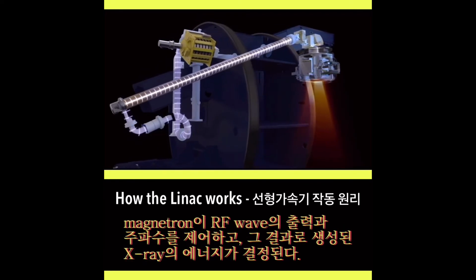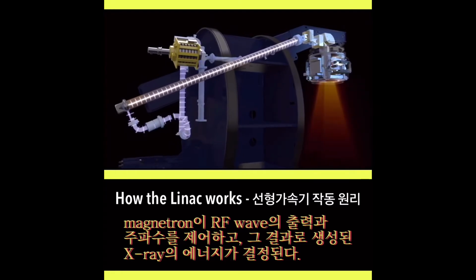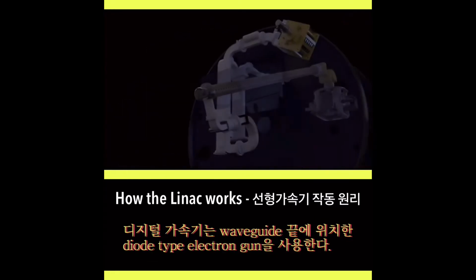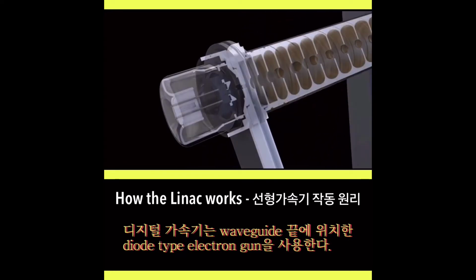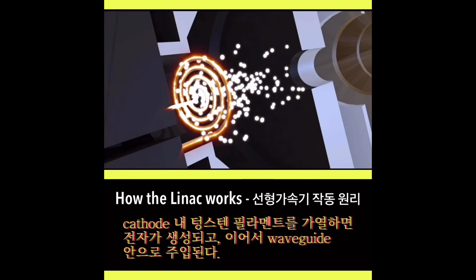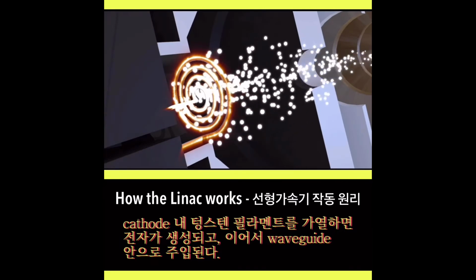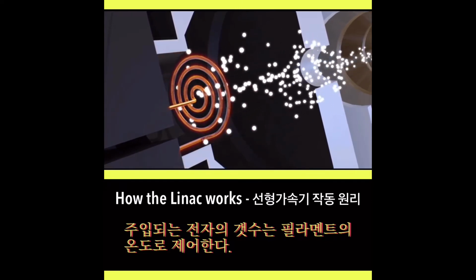The magnetron controls the power and frequency of the radio frequency waves, which determine the energy of the X-rays produced. The digital accelerator uses a diode-type electron gun situated at the end of the waveguide. The electrons are produced by heating the tungsten filament within the cathode and are then injected into the waveguide. The number of electrons injected is controlled by the temperature of the filament.